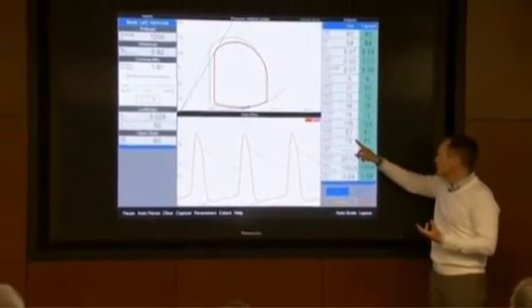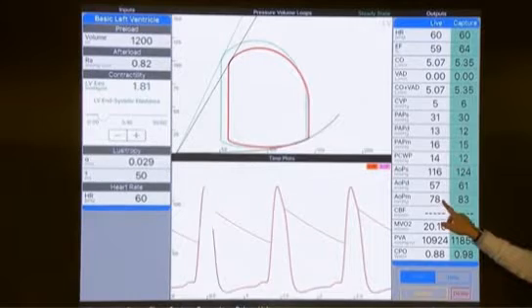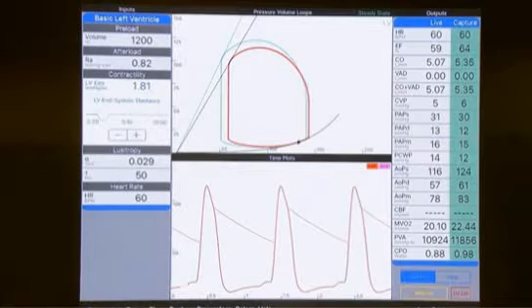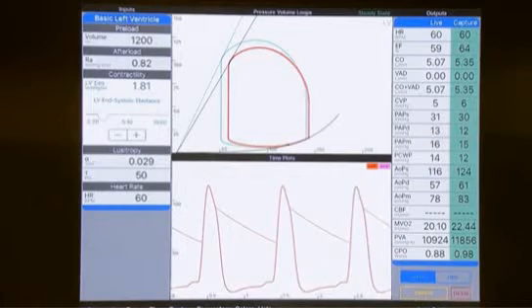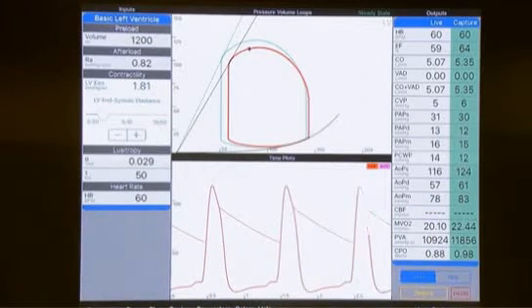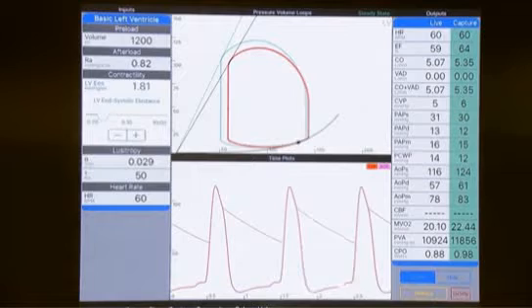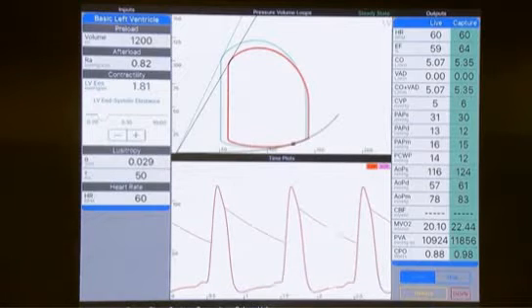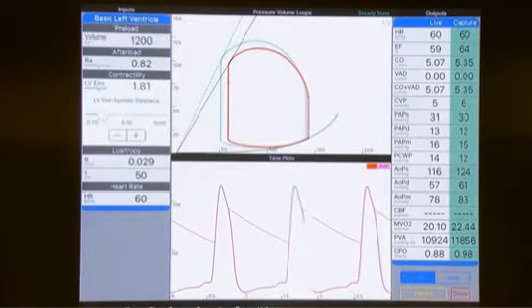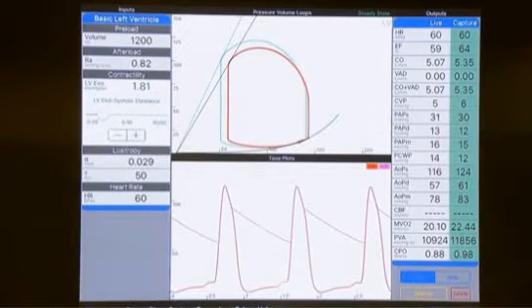Systolic aortic pressure is lower. Diastolic a little bit, the mean. This is the MAP, right? Went down. So we see reductions in pressure of the patient, reductions in cardiac output, and a reduction in EF. All of those we could have just ascertained by looking at the PV loop. The new loop is shorter, right? And the height of the loop is related to peak pressure, right? So we're seeing a lower pressure patient.